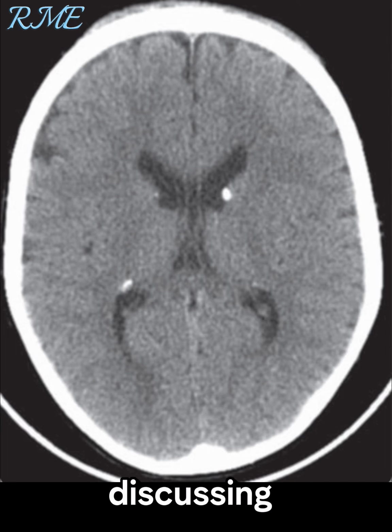Today, we'll be discussing an interesting case involving multiple subependymal foci of calcification. This is an axial image through the level of the thalami and head of the caudate nuclei from an unenhanced CT study of the head. There are multiple subependymal foci of calcification. No other abnormality is visible on this slice.